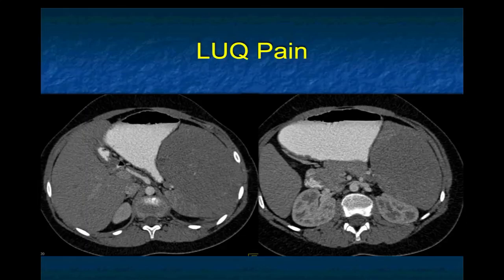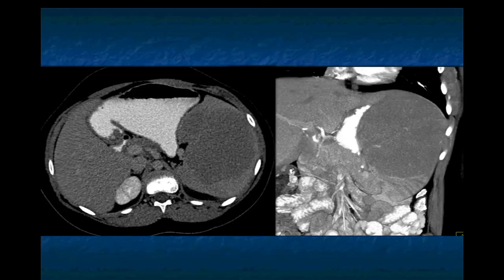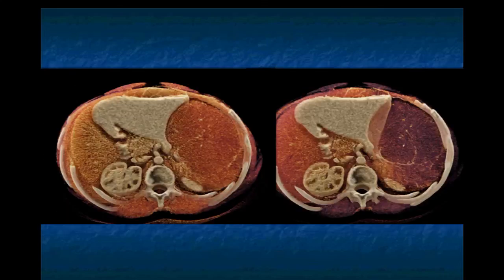Now, a couple of cases that are incredibly impossible: left upper quadrant pain, mass pushing on the patient's stomach. This is a large splenic mass. Now, it could be a hamartoma, though I like hamartomas to be more vascular. It's not going to be a lymphangioma. It's not low density enough. It's not a hemangioma. Could it be a sarcoma? That's a possibility. But there's no way I can call this a benign leave-alone lesion. You see the mass effect on the stomach, and it is kind of low density, but still, I can't really exclude a tumor, including lymphoma, but there were no nodes anywhere.